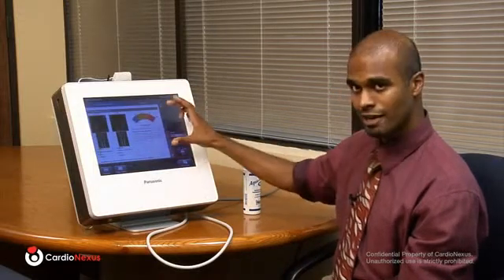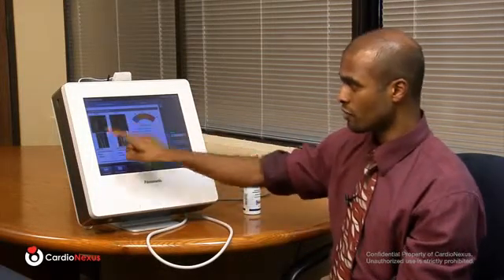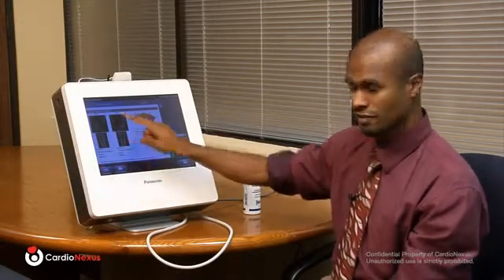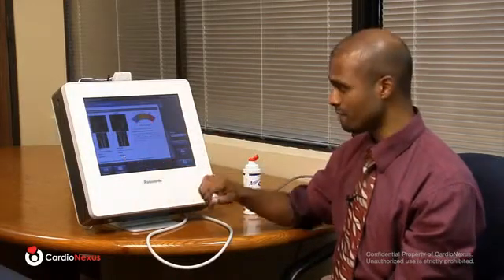Just below the Framingham, we present the IMT, the carotid artery wall thickness, numbers in the same manner. So both for the right side, you have a carotid IMT measurement. In addition, the plaque assessment. Similarly, for the left side, you're presented with a carotid IMT number and the plaque assessment on the left side.